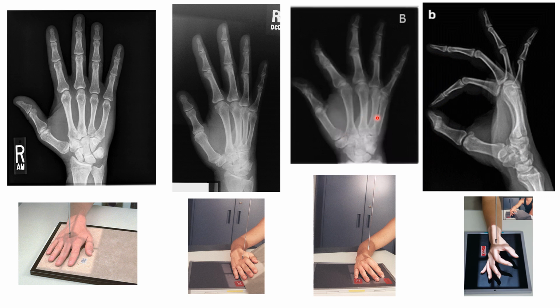So we still have that 45-degree rotation that we can see here on the x-ray, demonstrated by the metacarpals, but those joint spaces just do not look as pretty. So we could say that the first positioning is our most diagnostic imaging position for the oblique hand, but clinically you may be taught to do it this way.